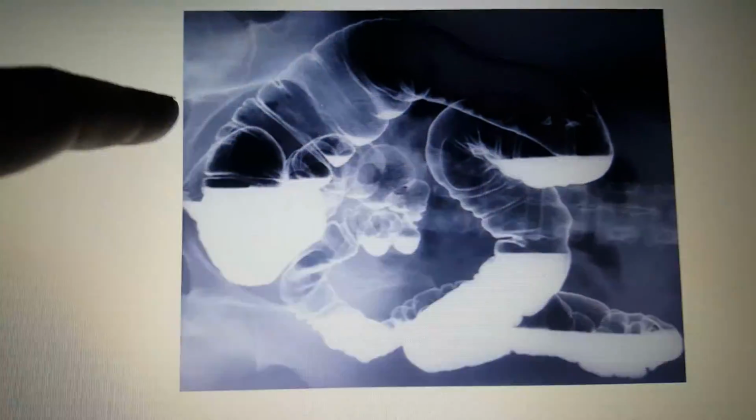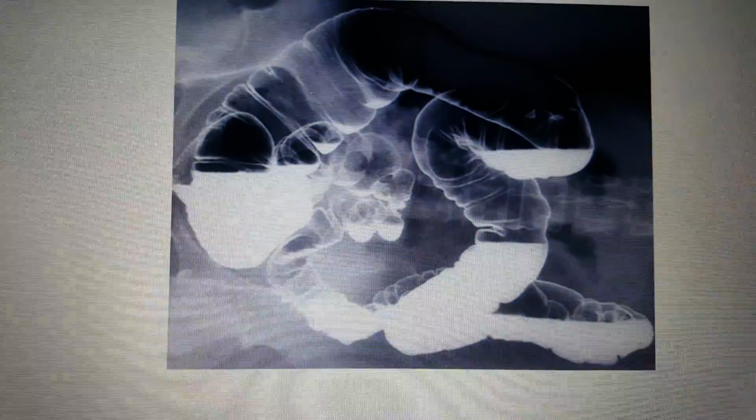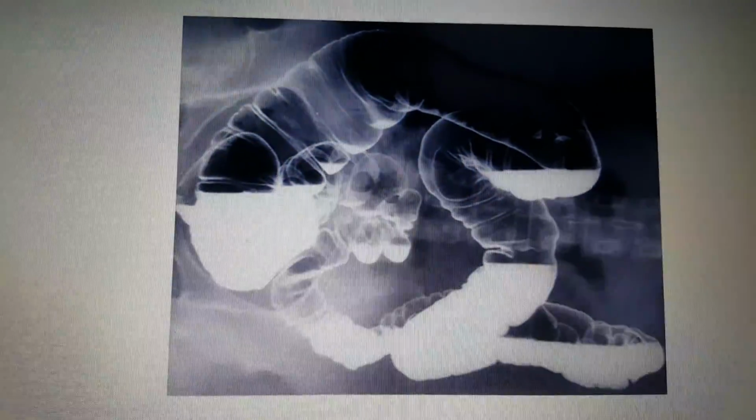Next is the left lateral decubitus, and for that you want to see the lateral side or the border of the ascending colon and the medial side of the descending colon. You also want no rotation, the entire colon demonstrated, and a marker indicating the side up.